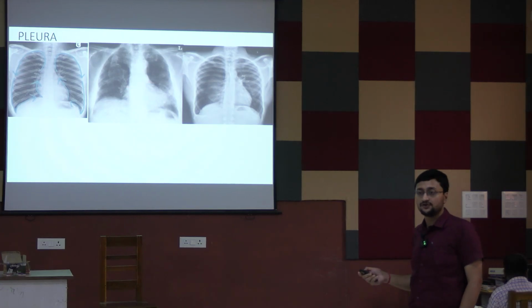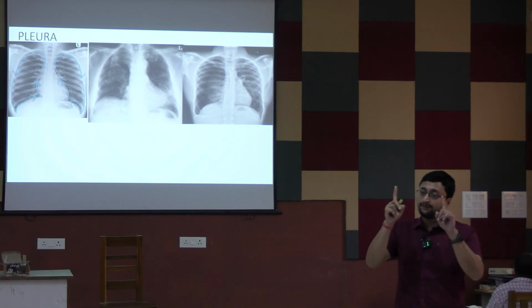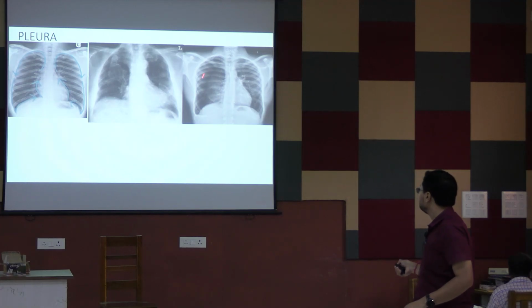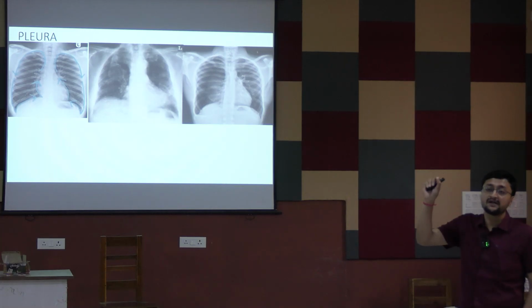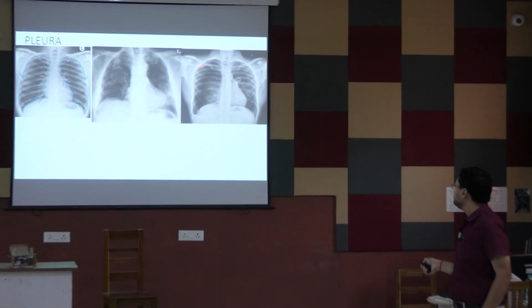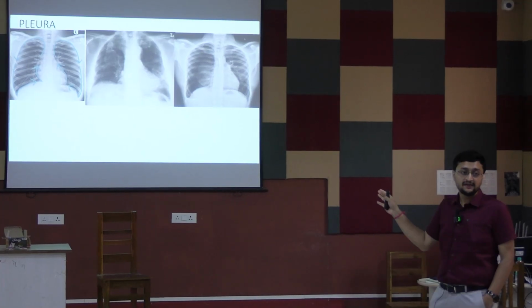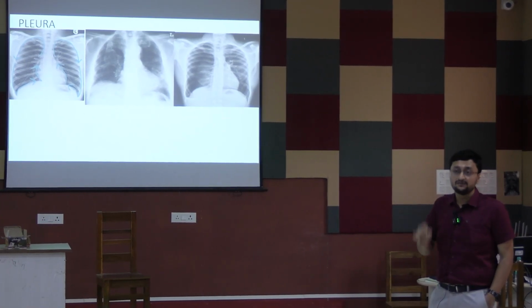Pneumothorax. This is a case of pneumothorax. So pneumothorax এর দুটো পয়েন্ট খুব ইম্পর্টেন্ট। One is hyperlucent area. এই যে this is a hyperlucent area. দেখ কম্পেয়ার কর এই সাইডটার সঙ্গে। লেফট সাইডের যে এরিয়াগুলো আছে সেখানে তো ব্রঙ্কোভাস্কুলার মার্কিং আর প্রমিনেন্ট। That means there are multiple white and black shadows. But in right side, this is devoid of any bronchovascular marking, and the area is typically hyperlucent.